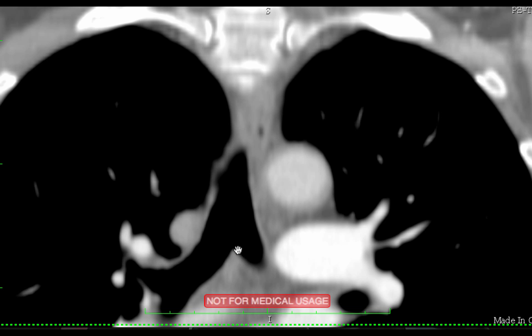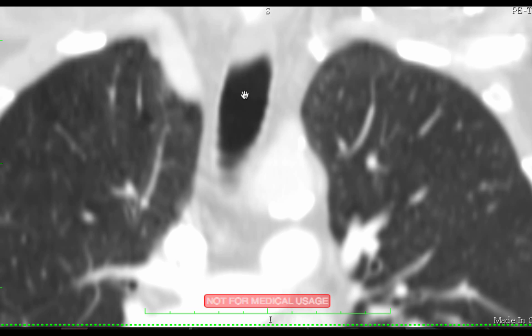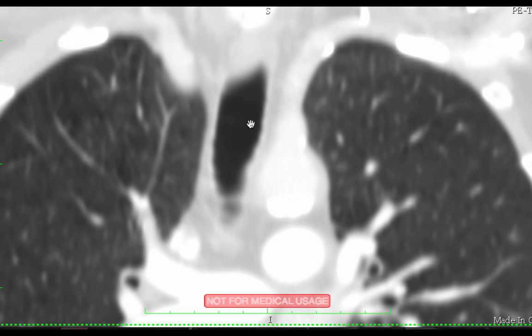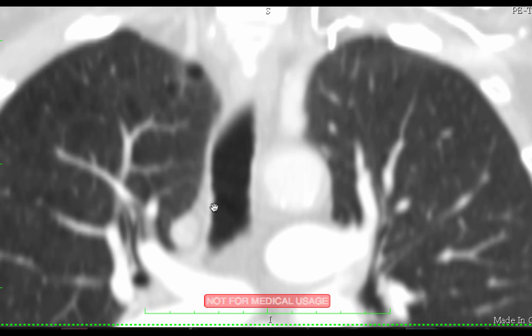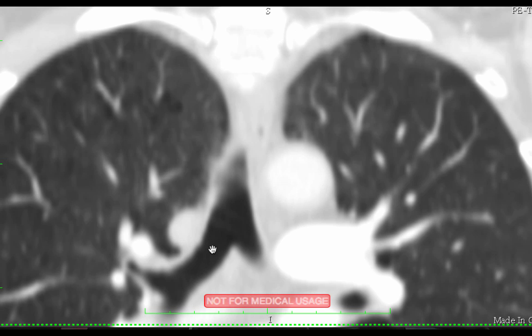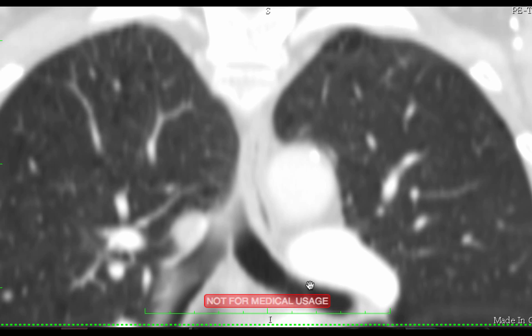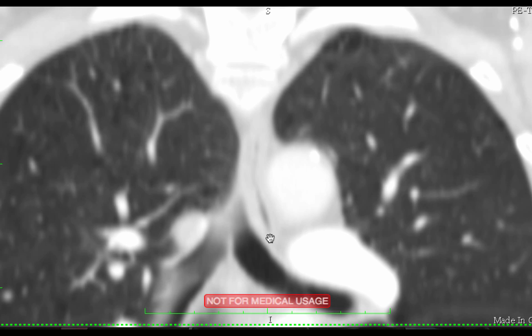Okay, then what would this little angle here be? It's the carina, because this is the trachea, and you can see the little ringlets. You can kind of get an impression of those little dents all along the side from the cartilaginous rings of the trachea. And the trachea comes to this carina. This little point here is just called the carina, and we see the right main stem bronchus and the left main stem bronchus. Now, I'm not going to go through the pulmonary branch anatomy, but that's going to be important for you to understand.